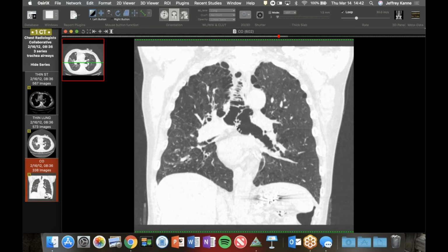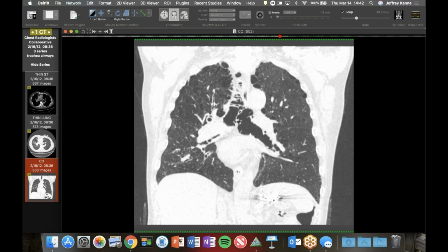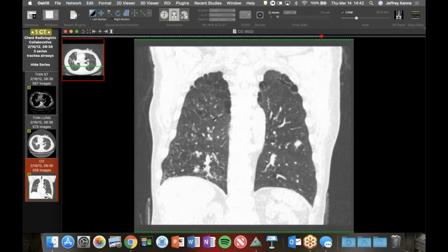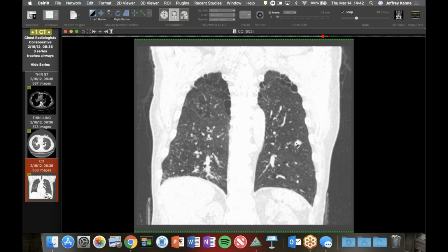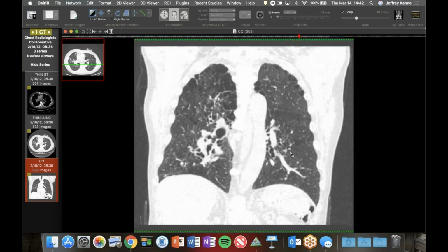There is a high association with malacia. I don't have expiratory images to see if that was the case, to see if that was contributing, and then led to the infections and the bronchiectasis. And then, of course, we know that's going to be smoking related, probably an adenocarcinoma down there.